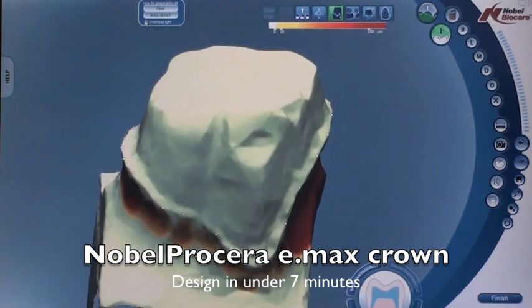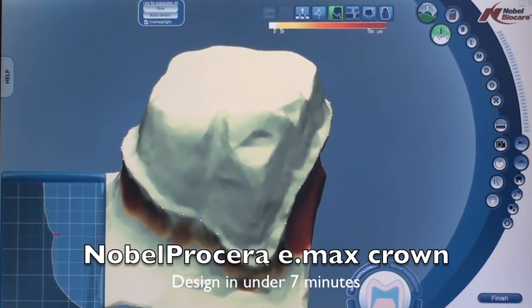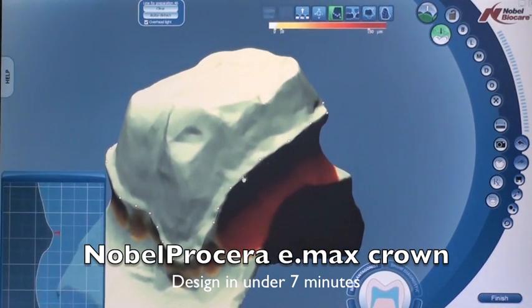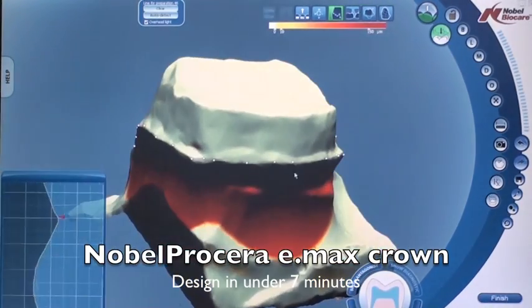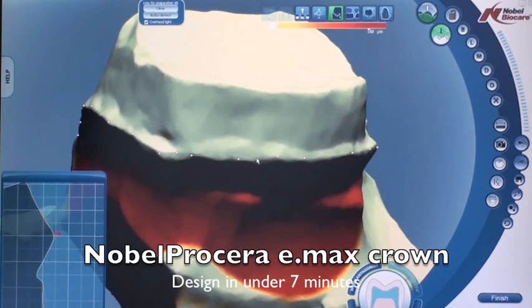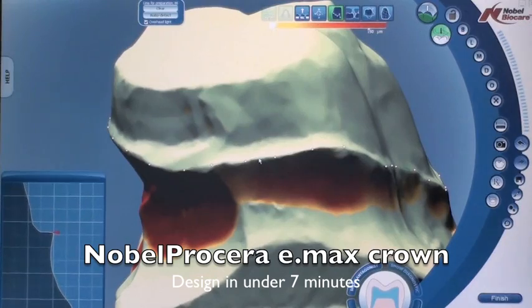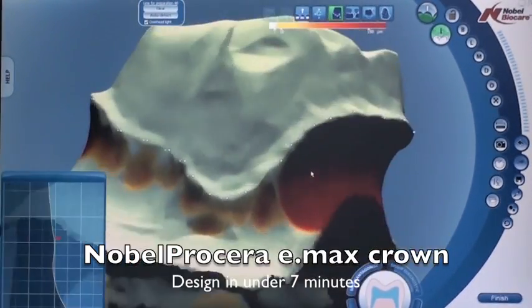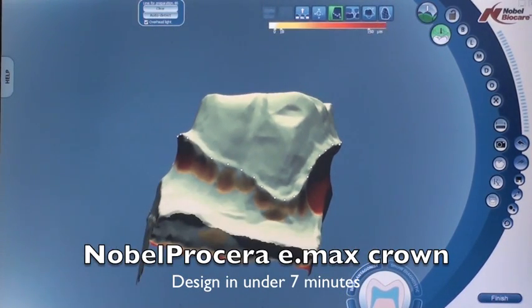So from there I turn on my overhead light and I open my 2D viewer, and then most of the time I start off in the buccal. I want to start off in the same place just to try to create a pattern, and that way I'm not just going over the margin constantly. This is an area where I find a lot of technicians can spend a lot of time and not necessarily making any improvements to the crown, but just wasting time. So it looks good.